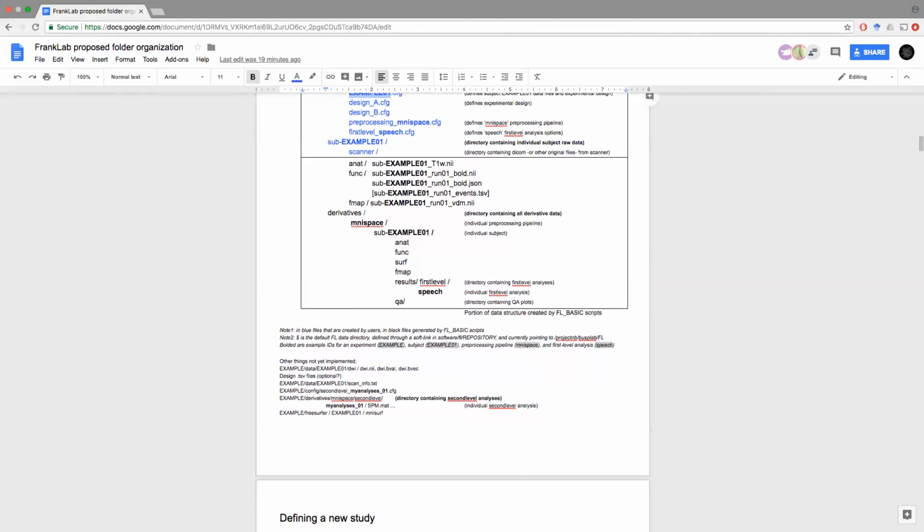So I, again, don't think it will make too much of a difference which particular version of the structural file you enter if you are planning to do normalization. But the short answer is yes, you can enter the T1 file from FreeSurfer as the source of anatomical data for either case, whether you're running the surface-based analysis or the volume-based analysis, and that will work perfectly fine. Okay. And even for both pipelines. So if you are running a different pipeline for surface-based analysis and another one for volume-based analysis, you can still enter the same T1 anatomical data for both pipelines, and it will be perfectly fine.